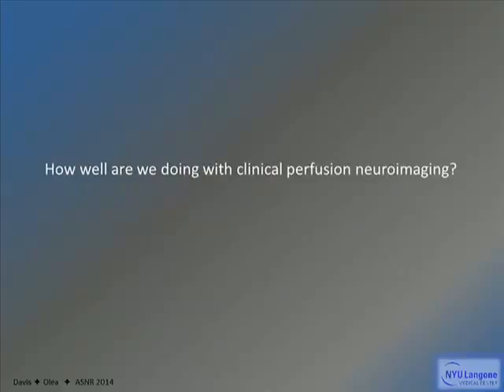So, that's it. We're done. Those are the indices that we have to play with. There's nothing left. So now let's take where we are and see how well we're doing.